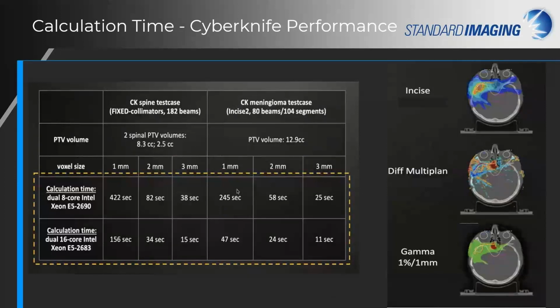So this is an example of a CyberKnife. CyberKnife calculations do take longer because they're a much higher resolution in general, and they typically take 1 to 3 minutes still. However, the key fact is it is dependent on your hardware and your calculation settings.